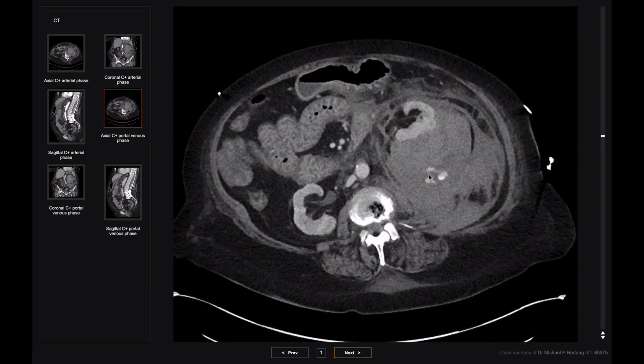And what that indicates is that this is contrast extravasation, and this contrast is spreading out with the passage of time, and it's doing what blood would do. So we can track what blood is doing by looking at the contrast. And so this patient is actually actively bleeding during the scan. This contrast shows us that the blood is actively oozing out into this space as we're scanning them.